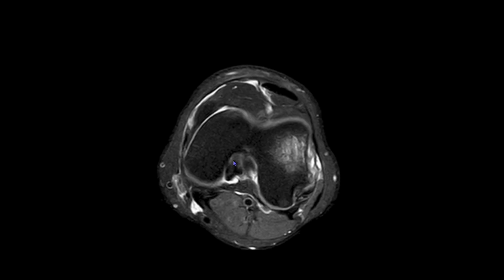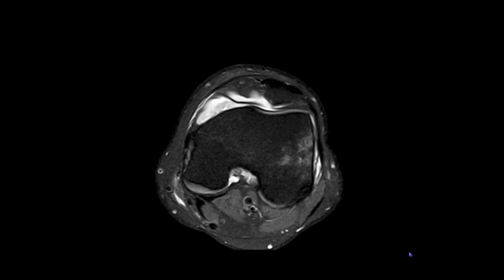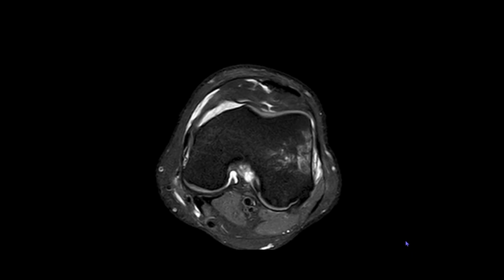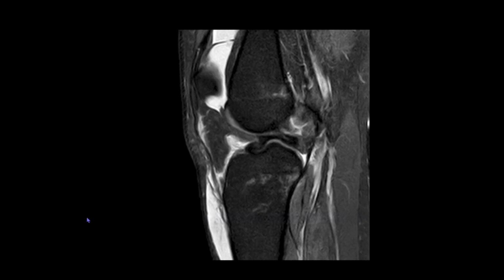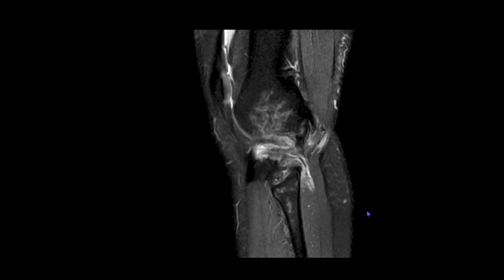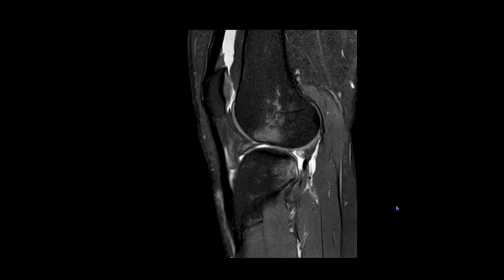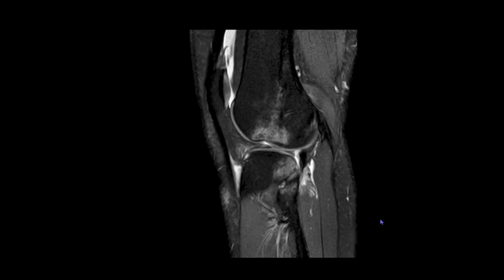Now coming onto the patellar retinaculum, the medial aspect of the retinaculum and the lateral aspect both can be traced entirely, so they are intact. Now coming on to the bone, there are multiple bony contusions. One, we can see the impaction fracture at the sulcus terminalis on the lateral aspect of the femoral condyle, and corresponding to it there is a kissing contusion, a type of bone marrow contusion pattern seen along the posterolateral aspect of the tibial plateau, whereby there is a minimally displaced or minimally compressed fracture along the posterolateral tibial plateau.